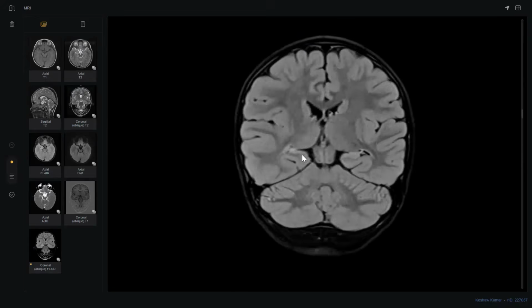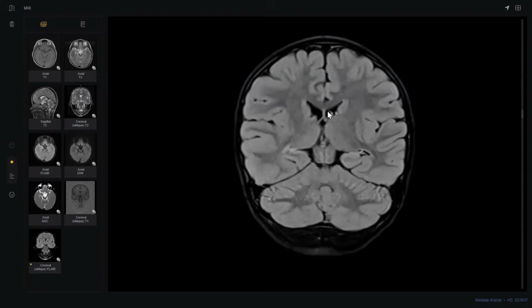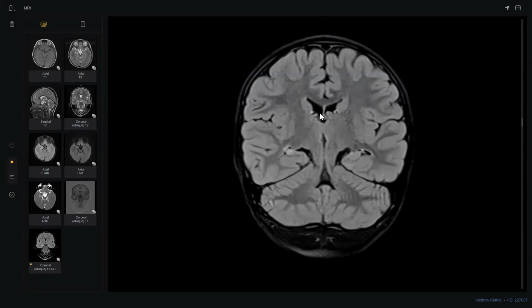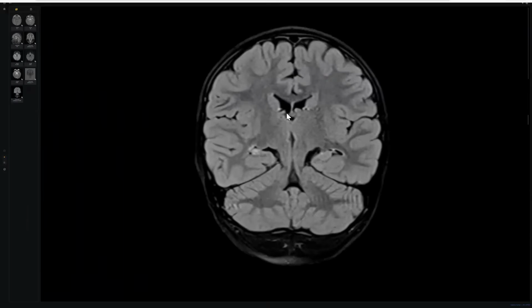And even in the real work, we sometimes do like this. Look here also, my colleagues, if you want one of the other criteria of the mesial temporal sclerosis, the fornix. This is the fornix. This is the fornix. Compare, is there a difference or not? Yes, sir. Very important.